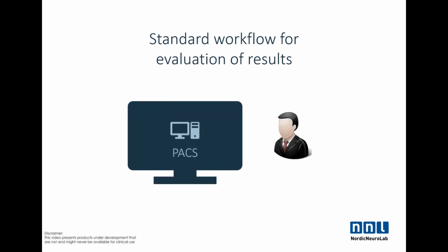So the user that will evaluate the results will sit in PACS and study the already processed perfusion maps created by NordicMediva and do his evaluations based on this. In this setup, the user does not need to access the dashboard on a daily basis. This is only necessary for system configuration, or if one wants to change the analysis settings or create new pipelines.